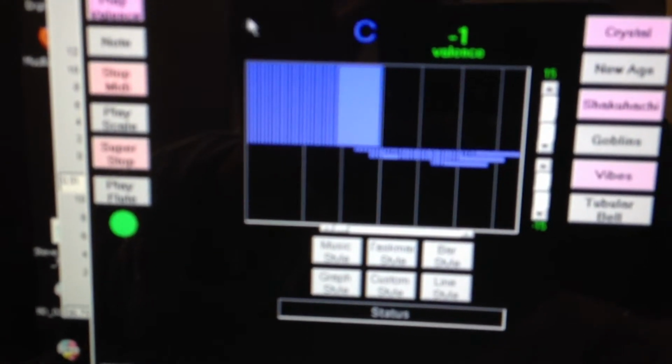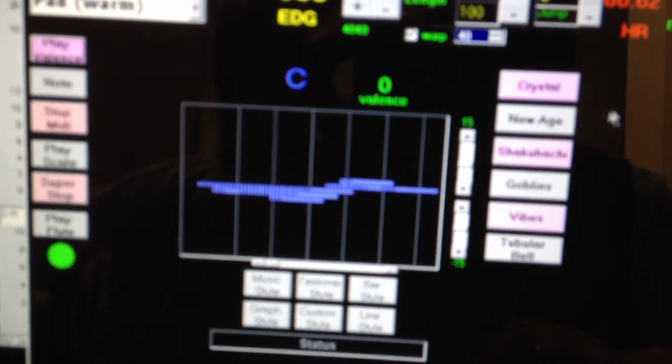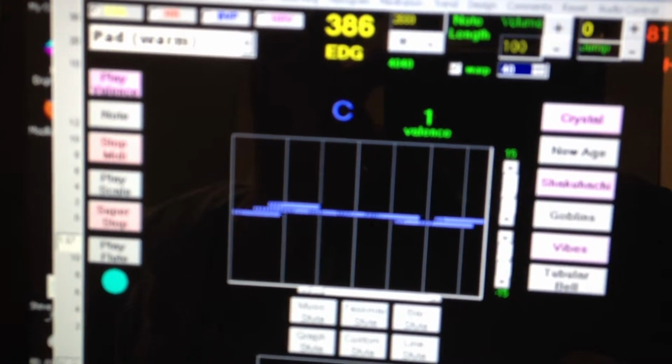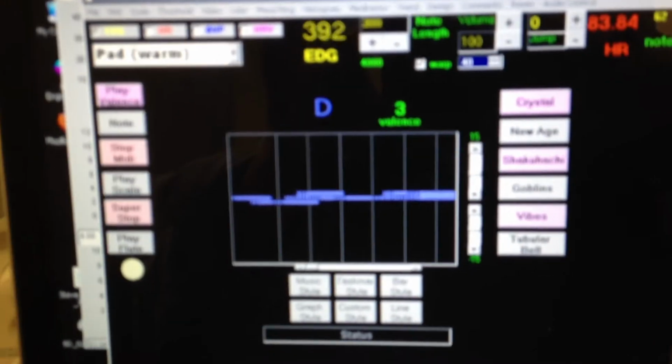Now we'll assign a tone, the default warm pad setting. We'll see what we get here. Could probably use the external speakers for this demonstration, but we'll see whether we get anything coming direct from the MacBook. And let's boost up our synth volume. Normally you wouldn't need to do that. And here we go.